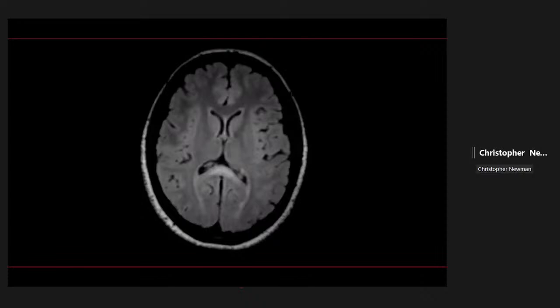All right, looks like we got an axial FLAIR. Mm-hmm. And let's see. I think the only thing that really stands out to me is the increased FLAIR, T2 FLAIR signal along the splenium of the corpus callosum with some white matter involvement posteriorly into the occipital lobe and a little bit around the atrium of the lateral ventricles.